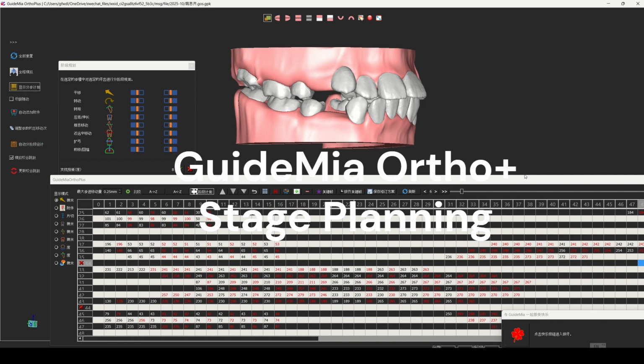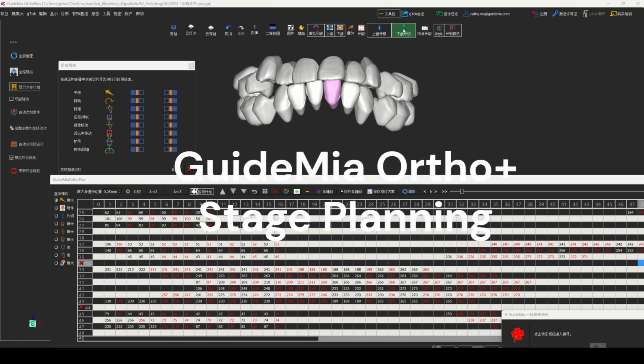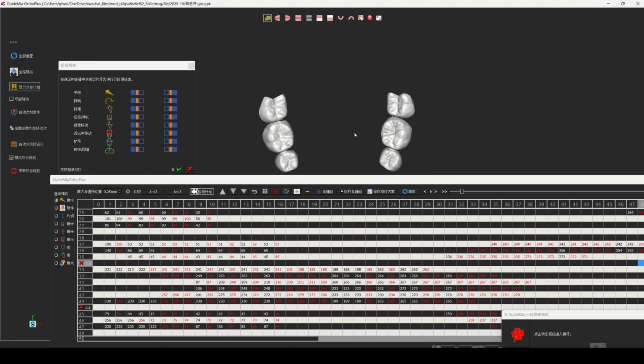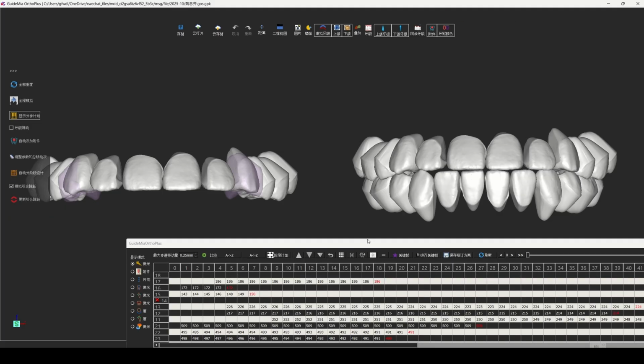Welcome to GuideMia channel. In this training session, we're going to show you a relatively complex case for stage planning. Here is a case where we are going to extract 4 teeth and then align the jaws. So let's take a look at how we are going to do this.